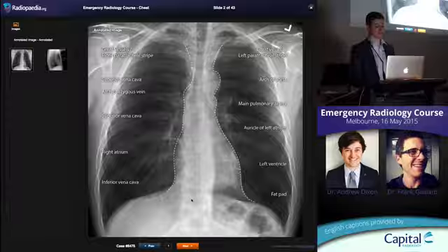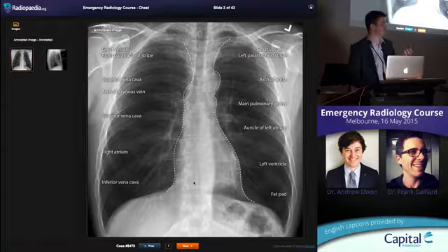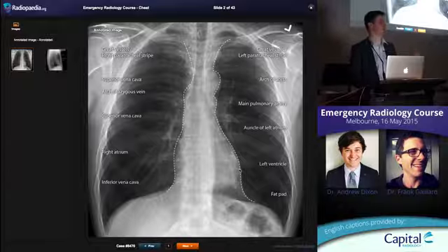Here you see the liver sitting underneath the heart. There's no interface between those two because they're of very similar density. You can see the intervertebral disc creating a little bit of a density difference, but even though you know the diaphragm continues right across the midline here, you can only see it out here where air is touching the diaphragm. As soon as the heart sits directly on top of the diaphragm, you lose that interface. We can use that to help us localize where pathology is within the lung. If we lose an interface, we know those two things must be touching each other.